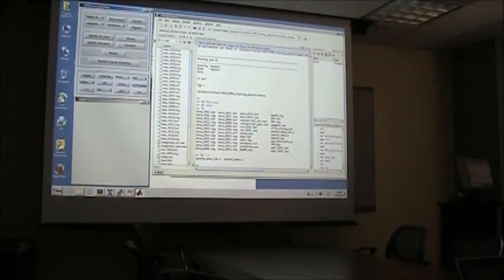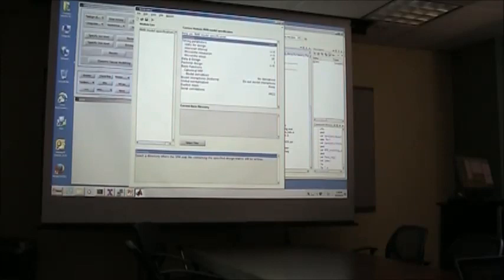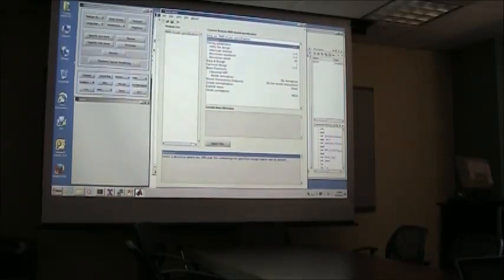So after you run through these steps, you would basically be here. You would specify your first level. I thought I might walk through these steps, as they're also in the manual. So you would hit this specify first level button.